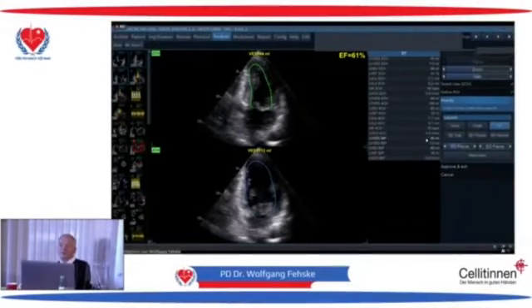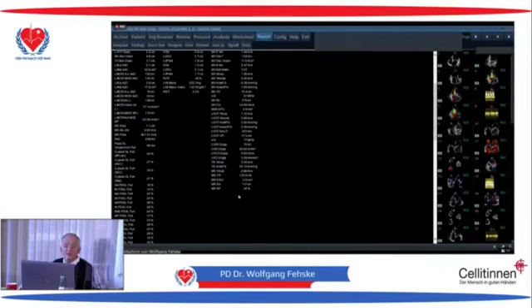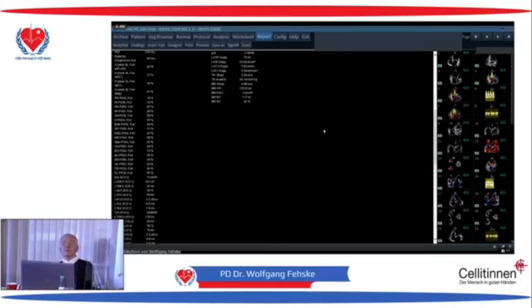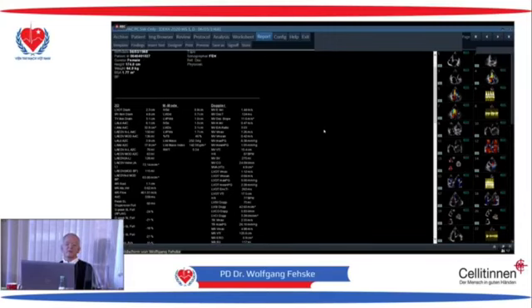So the stroke volume in biplane modality, and these are good images or sufficient images, is 66 milliliters of regurgitation volume. If you look at the measurements that are calculated, it is a regurgitation volume of 170 milliliters, and with the biplane modality, it has a stroke volume of 70 milliliters. So the water is running up the mountain. It is ridiculous. You see the point?